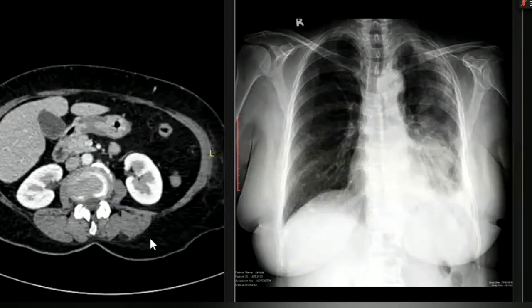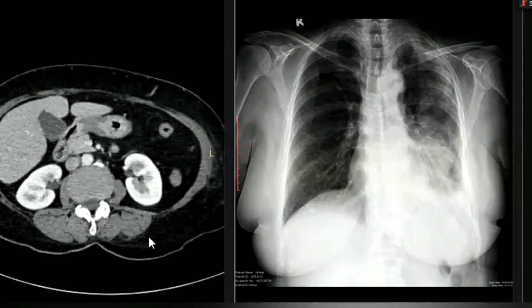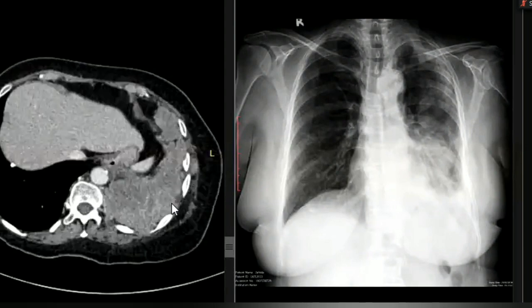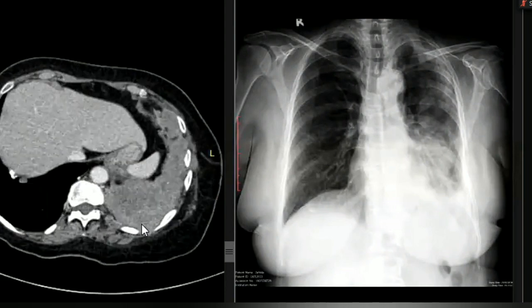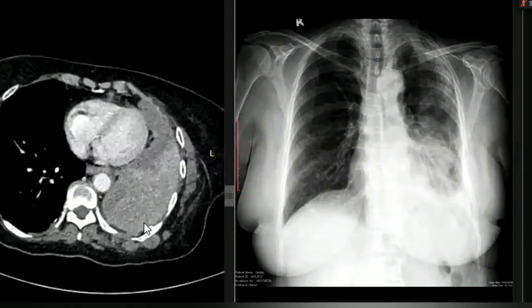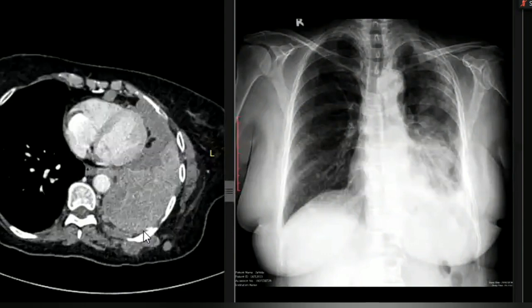For example, ma'am, is it necessary that calcified pleural plaques are present? Yes, there are some calcific specks, and you see, one is here. It's not that you always see extensive calcification. With these calcific plaques, you can raise a possibility, right? Always ask for the bone windows, and always give a description of the additional associations and complications of the known disease entity, right? Okay, ma'am. Okay, thank you so much.